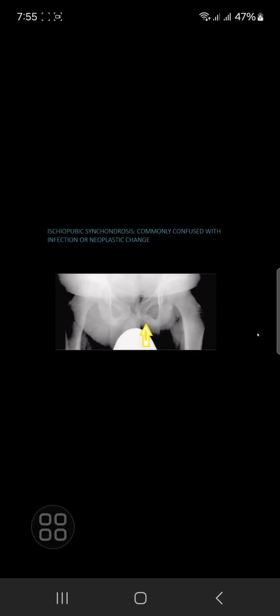This slide is showing the X-ray pelvis and the hip joint of a young patient, and you can see that there is an asymmetric, prominent, ill-defined sclerotic area involving the ischiopubic joint, which is the ischiopubic synchondrosis. It should not be confused with infection or a neoplastic lesion. It is normally seen on the left side, and it may be asymmetric, and there is no periosteal reaction or soft tissue swelling. You can also correlate it with the clinical history, and if you are not sure, follow-up might be helpful. So this is a normal ischiopubic synchondrosis, which is a normal variant in young pediatric patients.